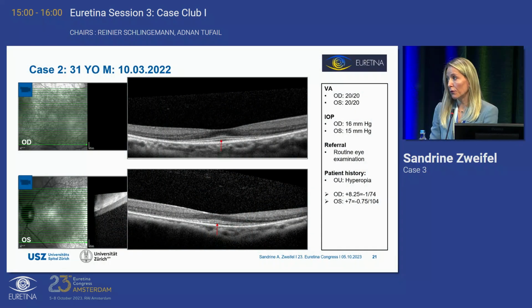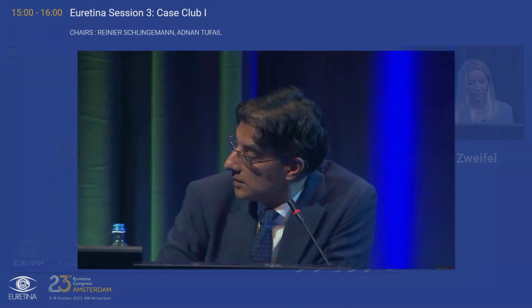What you definitely have to have in the differential is, when you look here at the second case, the Hunter syndrome, usually you have this perifoveal thinning, and you could have in the differential here hydroxychloroquine toxicity, where you have this flying saucer sign. So that would be for me in the differential. Great. Fantastic. Great. Yes, thank you very much.